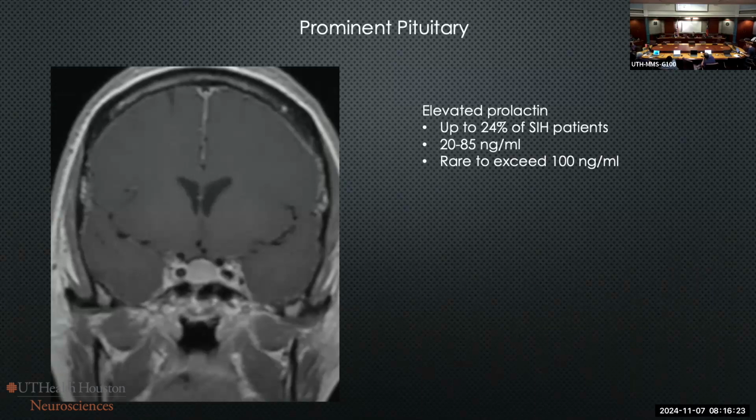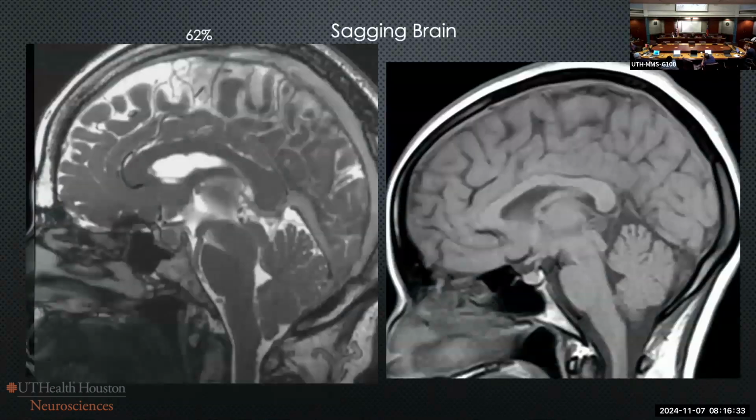Get the prior imaging, almost certainly they have it. Did they give gadolinium? Look at it yourself. Is there dural enhancement? Because that can help make the diagnosis. And now probably one of the most important points. Remember, CSF's leaking out, the brain is being sucked down through the foramen magnum. We're going to look for findings now that mean the brain is sagging.